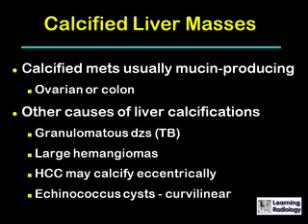Large hemangiomas can occasionally calcify. Hepatocellular carcinoma can calcify, and when it does so, should calcify eccentrically. And echinococcal cysts can sometimes calcify in a curvilinear fashion.